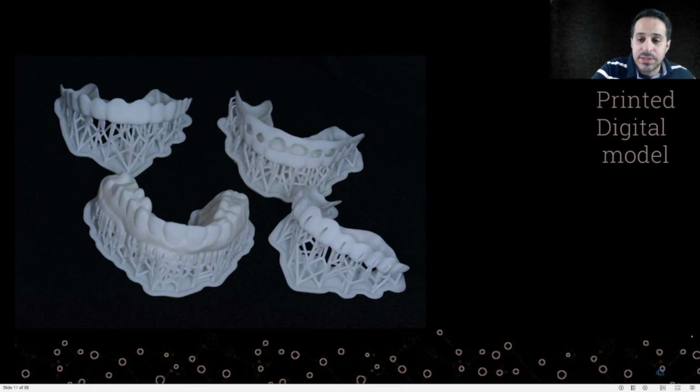And then after our approval, the lab can produce the guides for us. We have different types of guides. We have the printed model, which can be used later as a mock-up. This one is for the depth guide. These two guides are for gingivectomy and crown lengthening.